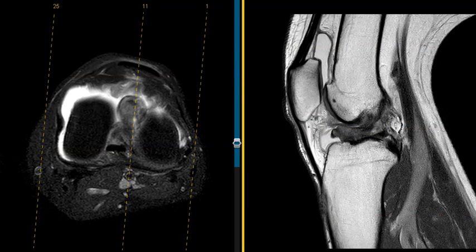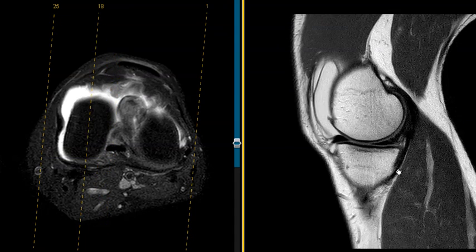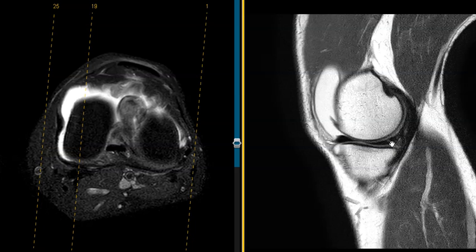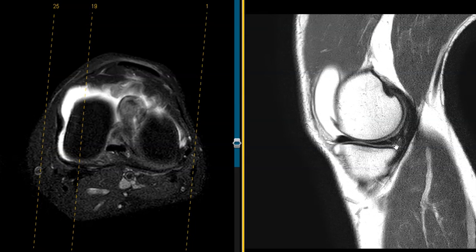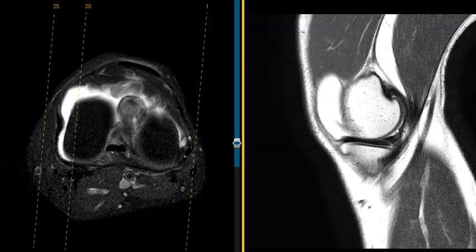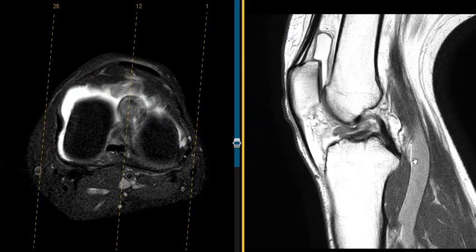And this patient also had a tear of the medial meniscus. There's a really subtle oblique line here. This is a meniscus tear that's almost completely healed. You can barely see the remnants of it. If we do another MRI, I bet that'll be even harder to see on the medial side. They also had a tear of the lateral side that was worse.